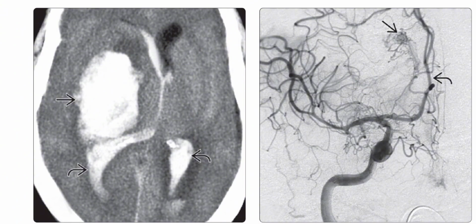Right image is the anteroposterior DSA image from a right internal carotid artery injection, and it shows an avascular mass in the basal ganglia hematoma with midline shift of the anterior cerebral artery. There is a cluster of abnormal arteries that is an AVM, which is fed by a large anterior choroidal artery.